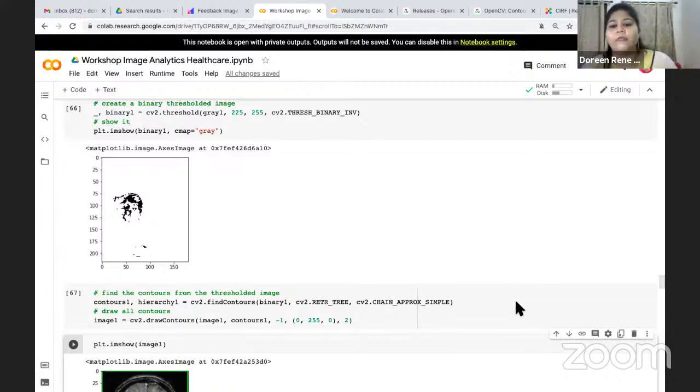Yes, Felicia ma'am. For DICOM images, for 3D images and image segmentation, you have different header files to work with a DICOM image, right? You need to load it with your DICOM image reader, and then using that, you'll be able to compute the image segmentation. You have a DICOM reader in Python.